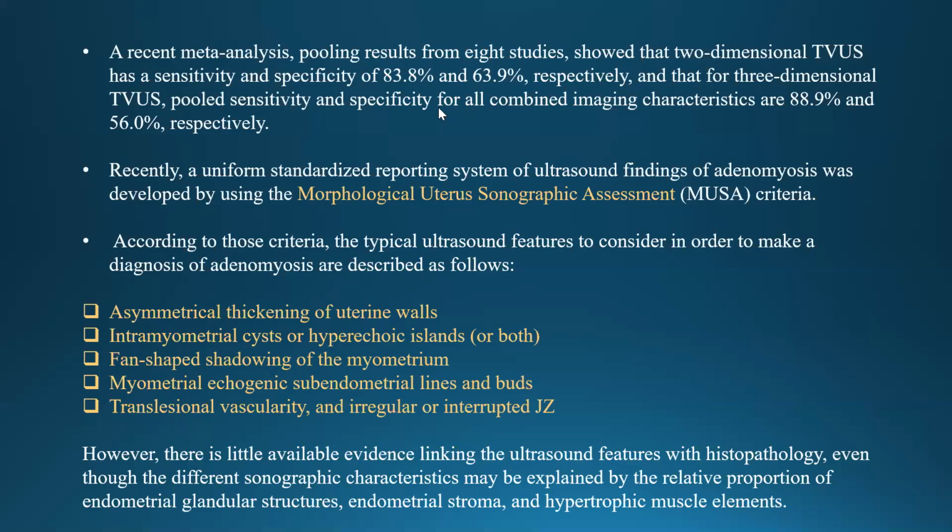So it's not too different, the 3D from the 2D, but I will show you by the end of this session how the 3D plays a very important role in some of the equivocal cases, but still there is a big role for the 2D ultrasound, just to put in mind.